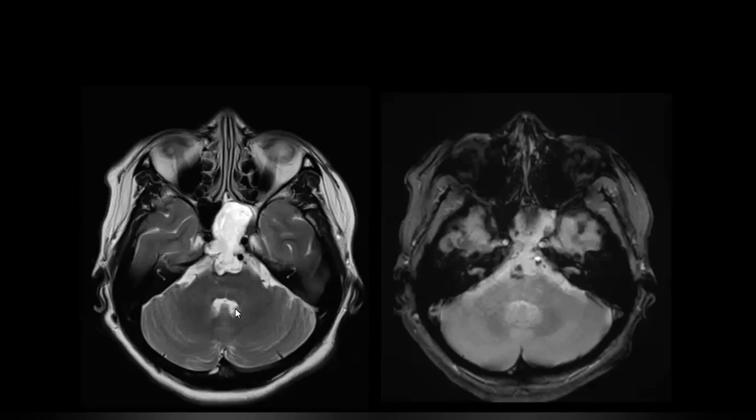A bright lesion which is solid and enhancing somewhat, there are only two lesions which can be that bright. Either they could be chordoma or chondrosarcoma. This lesion is in the midline, so that feature favors chordoma over chondrosarcoma. So right now we have two features: it has a well-defined margin and it is bright on T2. And on diffusion, if you look at the ADC here, it is kind of bright, so there is not much diffusion restriction.